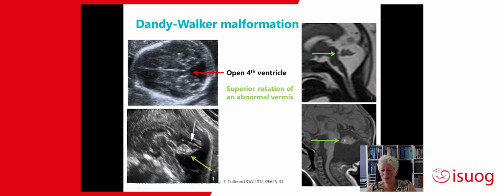And we hardly can see a fastigium over here. We're not really sure what's the primary fissure. And we do not have this ratio of 1 to 2 if we look at the tissue of the vermis. And besides that, we can see an elevated torcular. And the insertion of the torcular is high, where it actually should be somewhere over here. Or here, if we look at the neck muscles, it should be over here.